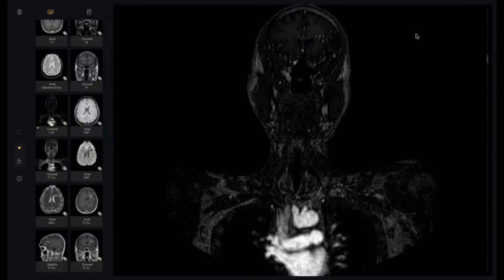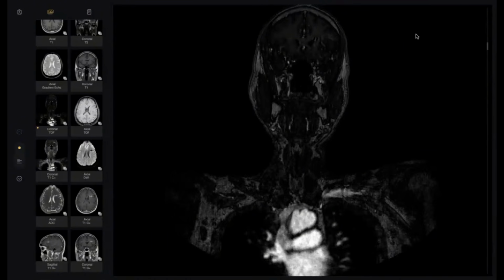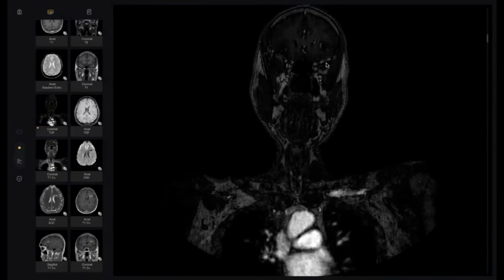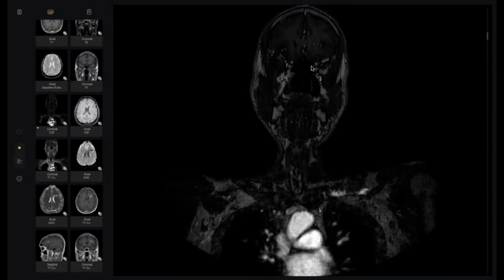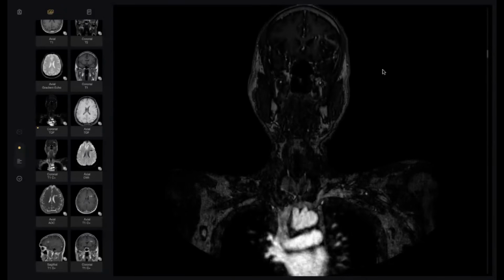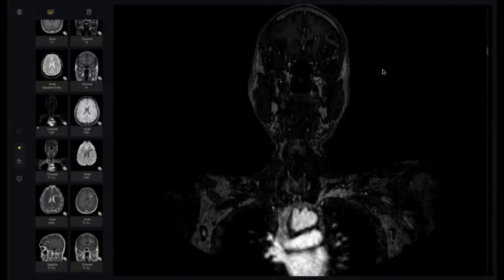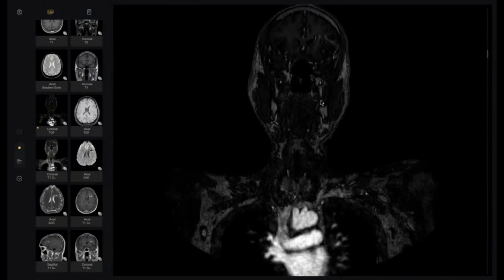Look here. This is the draining vein. If you follow it, I think it is directed to the cavernous sinus. Okay, my colleagues, all DVAs start intraparenchymal and must go to a draining vein. This draining vein must end in one of the dural sinuses.